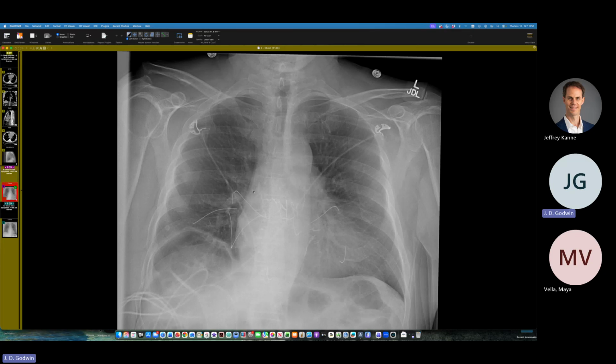So this person had that kind of closure here with these wires, which have fractured. And if you look carefully, you see that there's a deficit of wire on the left here. We've got this big fragment and this fragment. We have a lot closer to intact on the right here, wires that are almost the complete butterfly. And then we have this one out here, which seems to be aberrant.